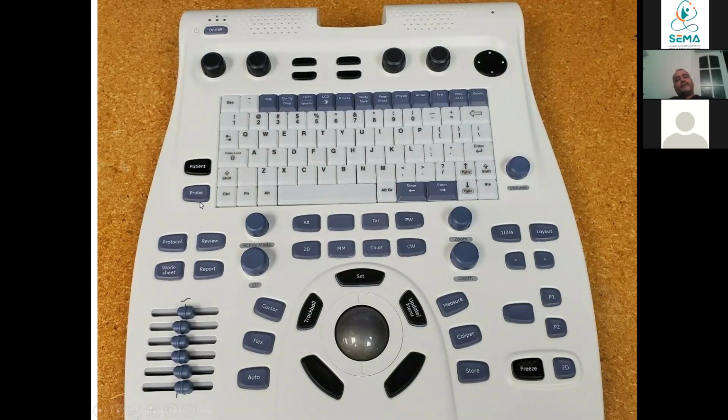So you will select the probe, and it will show what kind of probe you require, pediatric or adult. After that, you will select what kind of probe you use. Usually for neonates, it differs from machine to machine, but usually the small head, usually 10S or 12S, the smaller ones, whereas 4S or 6S, the 4S is for adult and the 6S for pediatric cardiology.